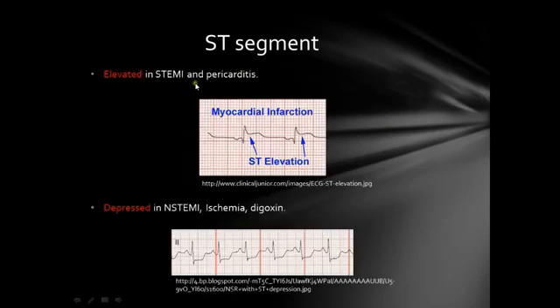It is elevated in ST elevation myocardial infarction and pericarditis. You can see here the ST segment elevation, and this is the T wave, and this is the TP segment. So this is the ECG's baseline right here. This is the TP segment. This is the ST elevation.